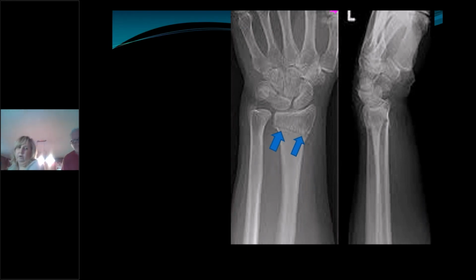This patient also has a distal radius fracture, although this one's slightly impacted, really no significant angulation. So you could say, hey, they got a slightly impacted distal radius fracture with no significant dorsal or volar angulation. Again, very easy to treat. Put them into a splint if you're in a clinic or in the ER or urgent care, and then turf them on, and they'll eventually get a short arm cast.